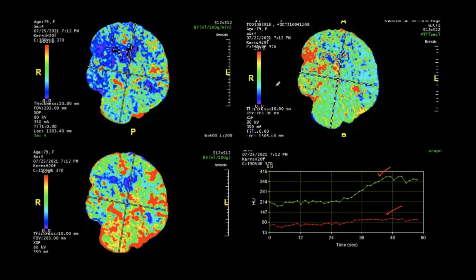But when I'm looking at it, I did realize in the previous CT that these are the areas that I was concerned about, right? This is not the RAPID. It's the one that normally the radiologists preferentially look at. So when I look at these, I told you guys, check the labels up here so you can tell what kind of parameter we're checking. So in the mean transit time, you can see the increase in the region that we were concerned. Whereas the blood flow, it's decreased, and in blood volume, it is not as much decreased.